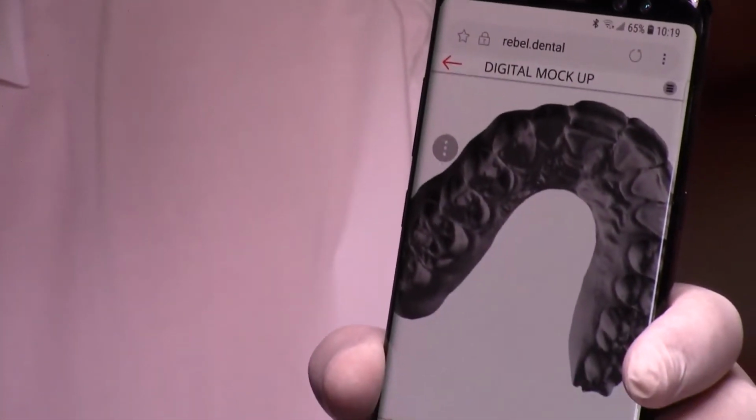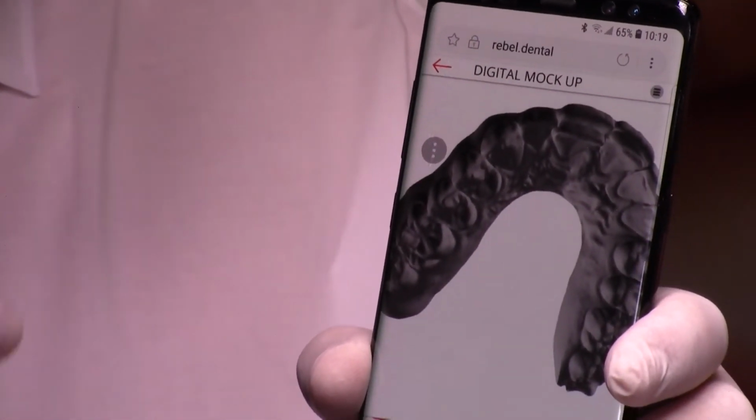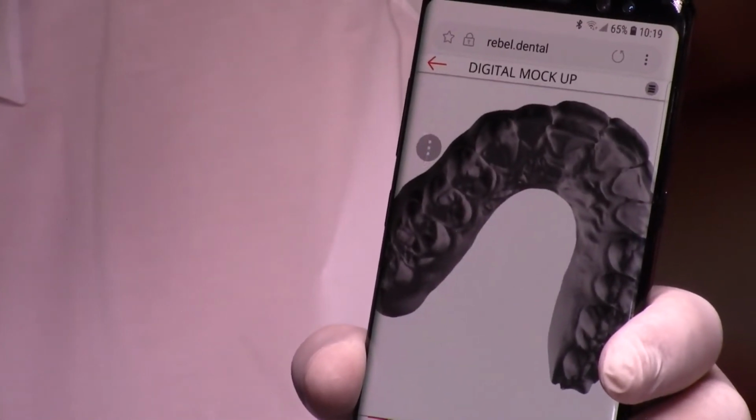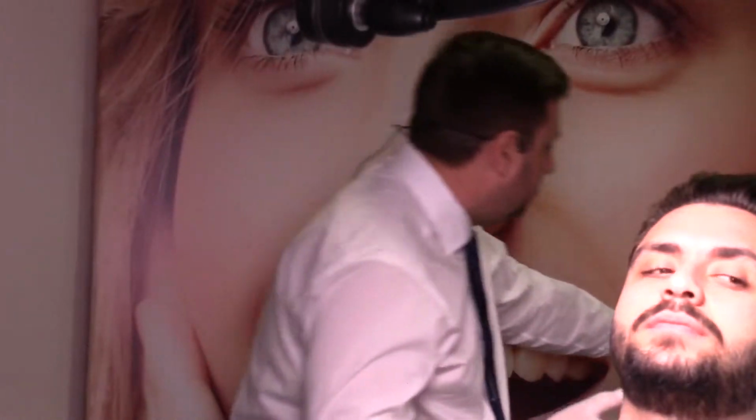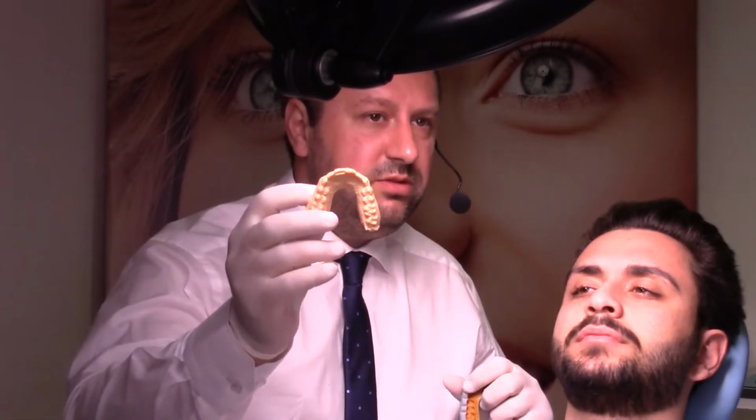The patient's teeth could be behind, so you can see how much you have to change the position of the teeth if you work orthodontically. So now I will show you the printed STL model, an exact copy of the design.